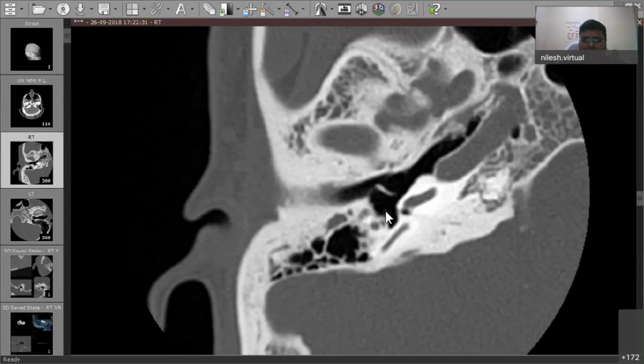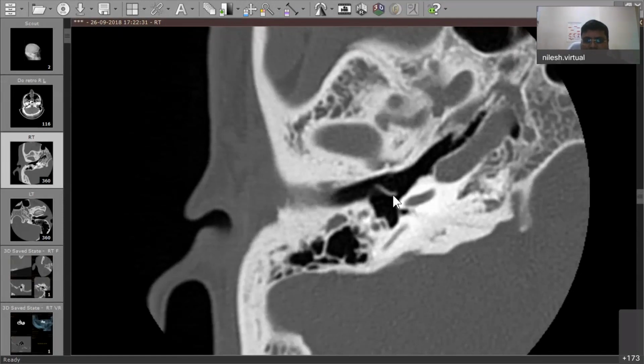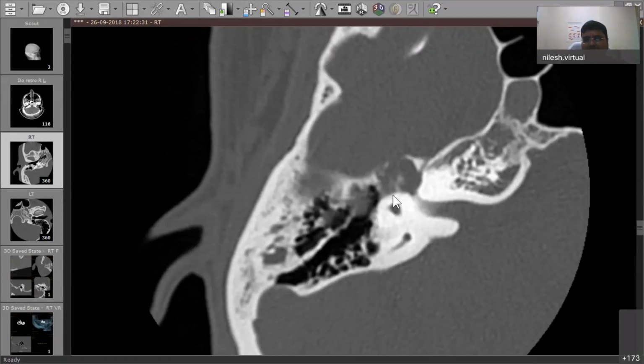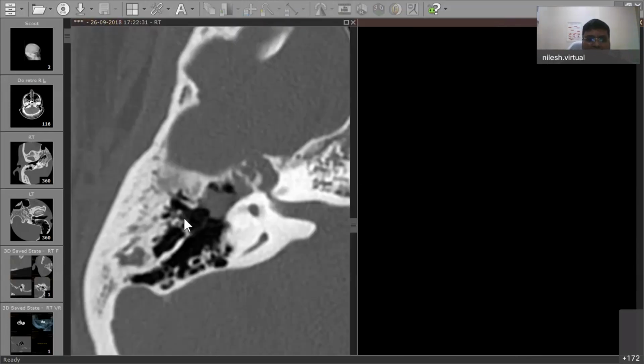And again, if you go down, see the place which we generally see through the otoendoscope or otoscope, that place looks absolutely normal. There is no disease in this part. So facial nerve is affected immediately after exit from the internal auditory meatus. That is immediately after the labyrinthine segment. But clinically, you could not judge what this disease is. That's why we got the non-echoplanar diffusion weighted imaging, which showed focus of, I'll make it coronal.